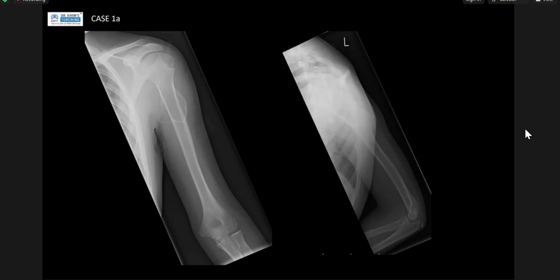In this view, I suggest this is projecting from the bone. It has a narrow zone of transition. I need another orthogonal view to better visualize the bone.